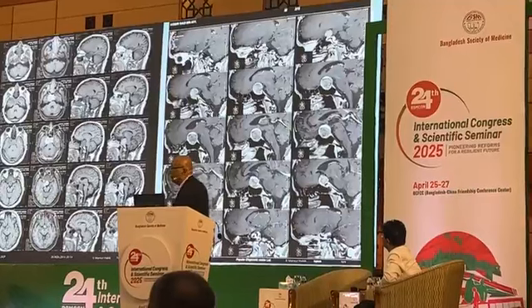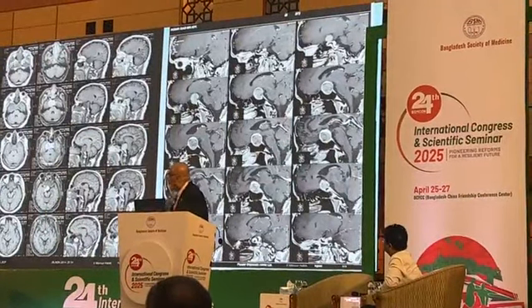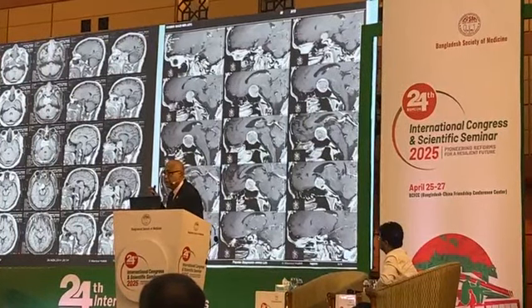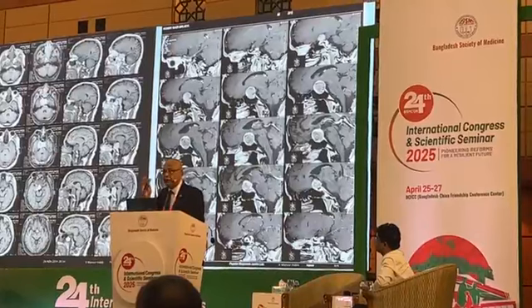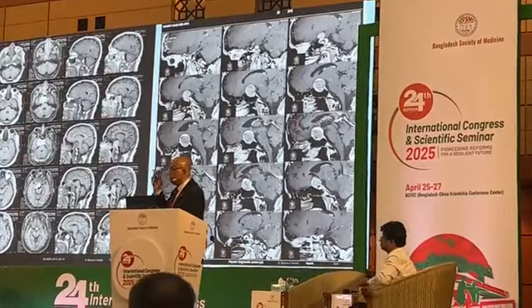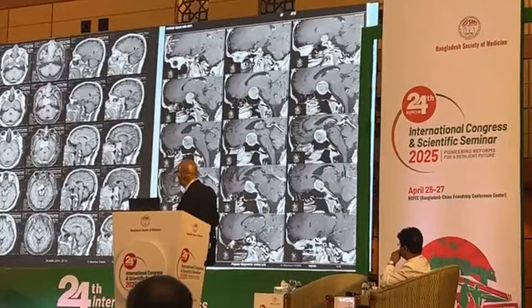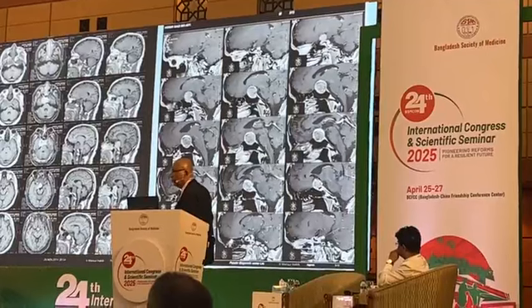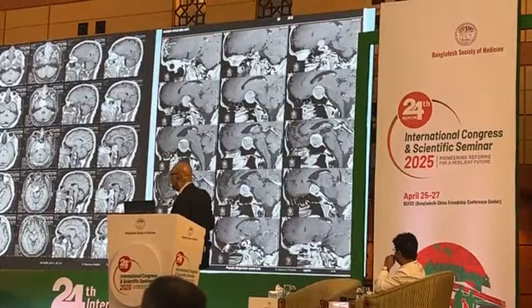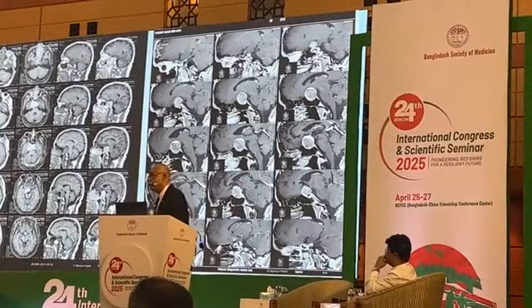This is an example, very likely, of pituitary adenoma. And this one is probably a craniopharyngioma that has extended up into the suprasellar region, down into the sellar region. So both are possible: first is pituitary adenoma, and second is craniopharyngioma. I would put this one as craniopharyngioma first and pituitary adenoma second, and this one as pituitary adenoma first and craniopharyngioma second. As I said, to get the full marks in the exam.